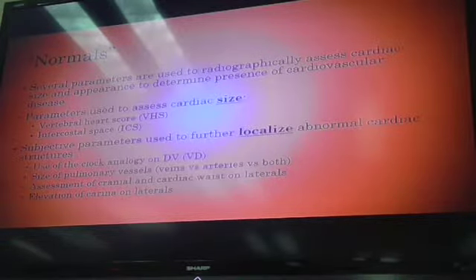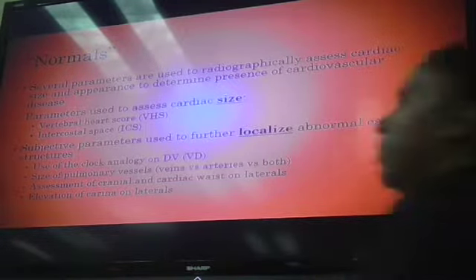And so there are some clues, keys or characteristic signs that we'll see, okay? When we talk about right-sided heart changes, there are going to be certain abnormalities that we see based off of these parameters here that will help us kind of focus in on our differential list, all right? So let's talk about these in detail.